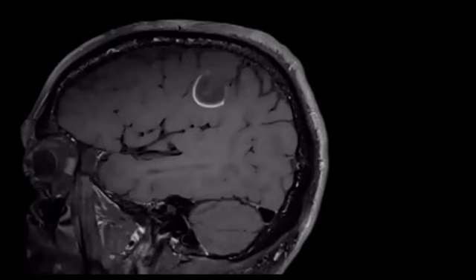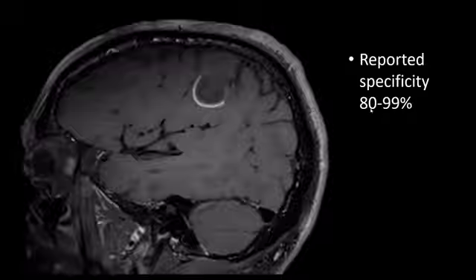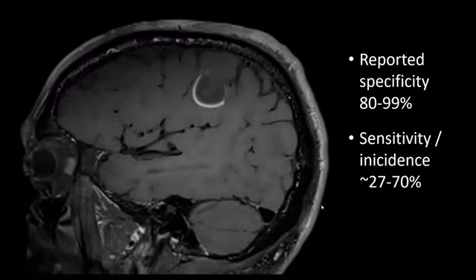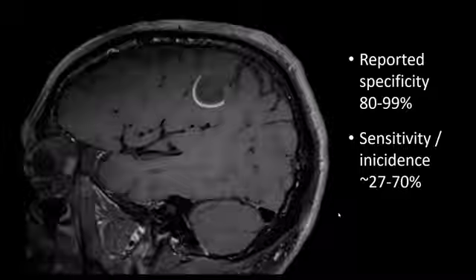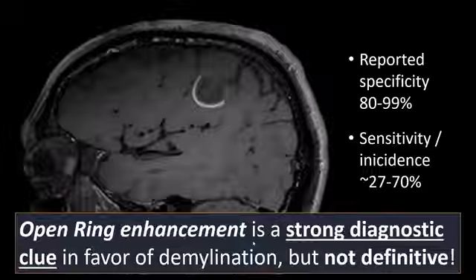Well, true pathognomonic signs or Aunt Minnies are actually quite rare, I think. You never reach 100%, or you at least also have to keep an open mind. So there's a reported specificity for open ring enhancement for demyelination of 80 to 99%. So those are good odds. The sensitivity, however, is a lot lower. So if you don't have the sign, it basically doesn't mean anything. And it makes sense because you have multiple sclerosis lesions with no enhancement or maybe another pattern of enhancement. So it's a strong diagnostic clue in favor of demyelination, but it's not definitive.